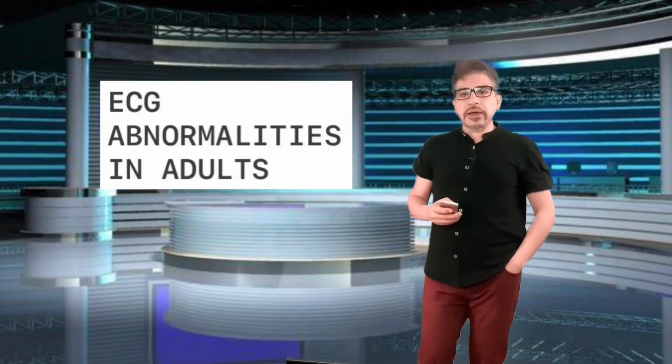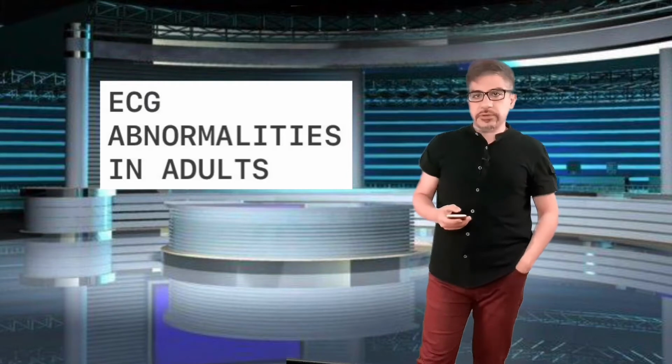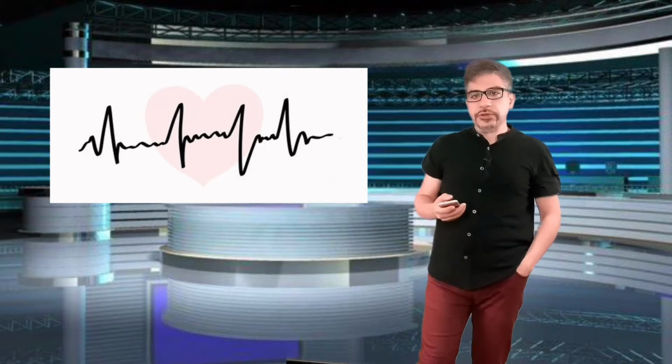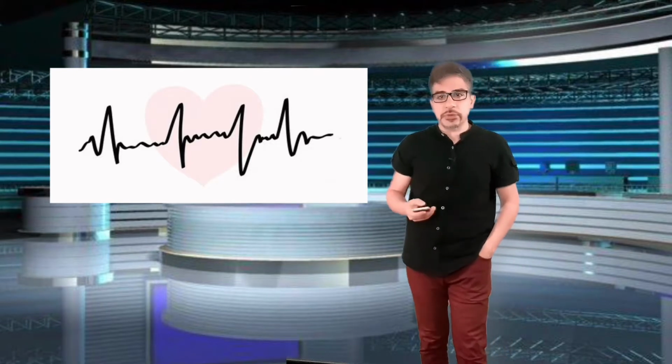Today we're going to talk about ECG abnormalities in adults in a nutshell. If you need a reminder of the elements that make up an ECG, please pause here and take a look at the video I posted last week on ECG basics. Then come back, there's plenty of time.